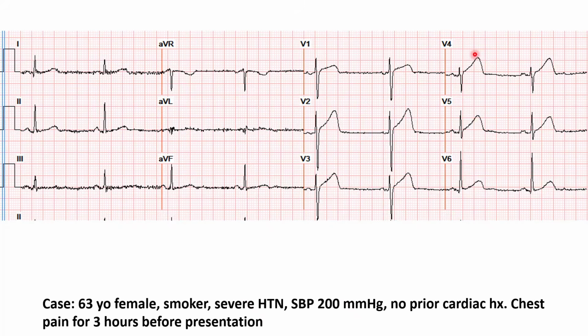And you have an ST-T morphology that is convex or straight upward, looking almost like a dome, in leads V4 through V6. Occasionally, you may see a T wave that is large compared to the QRS at the transition zone, when the QRS moves from negative to positive. But when you have it outside the transition zone, or in multiple leads, that becomes even more concerning.